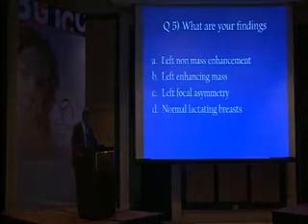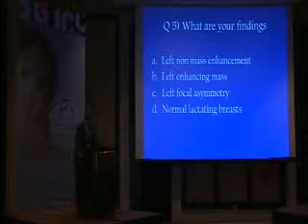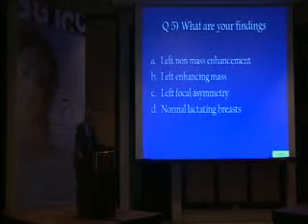So, just to recall what you have learned this morning, was this a non-mass enhancement, or an enhancing mass, or a focal asymmetry, or a normal lactating breast? Start voting now.